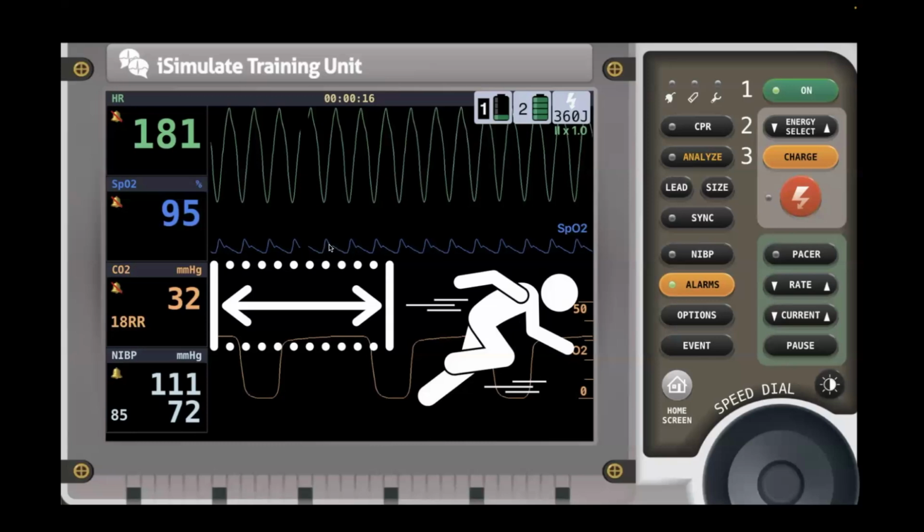In this case, we see a pulse ox pleth with every QRS, so this would be VTAC with a pulse. Definitely a concerning rhythm. It's not an efficient rhythm and doesn't last very long. The body doesn't like it, the heart doesn't like it. I guarantee the patient would have let you know also. Usually you don't run somebody with isolated toe pain or ear pain and find them in VTAC. This would be that person with lightheadedness, chest pain, back pain, neck pain, jaw pain, who feels like they're going to pass out. This is a wide complex tachycardia above 150, and we know they have a pulse because the pulse ox pleth matches. One quick catch over here in the corner: that low end tidal tells you that you have diminished perfusion, which is a concern as well.